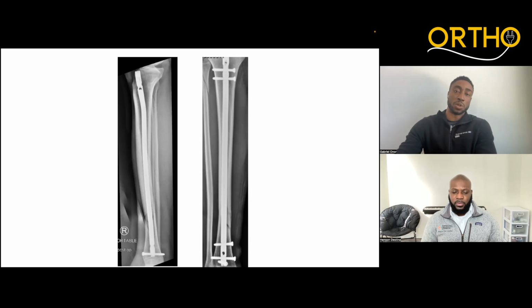And because of how distal the fracture of the tibial shaft is, the entry point of the nail doesn't necessarily affect it. If, let's say, this fracture were more proximal, you would definitely be thinking more about using a suprapatellar approach so that you could get an entry site that more adequately captures the site of the fracture.